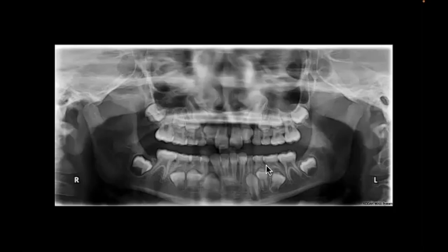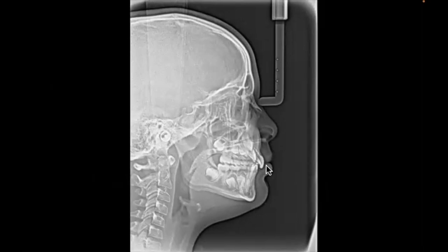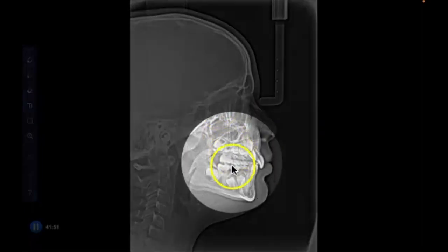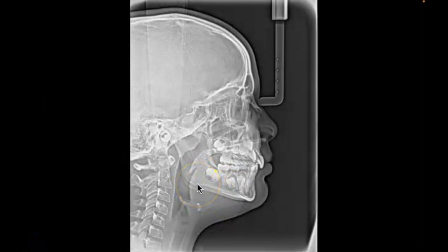All right, so we have bigger teeth, we have a smaller upper jaw. Let's look at this here. This was our deep bite. You can see now, skeletally, the mandible doesn't look as retrusive as it did in the profile view. That may be in part because of the way this image was taken; you can see the head is turned up a little bit. The mandibular length looks a little short. We didn't measure it out here, but it looks a little bit short, but not terrible.